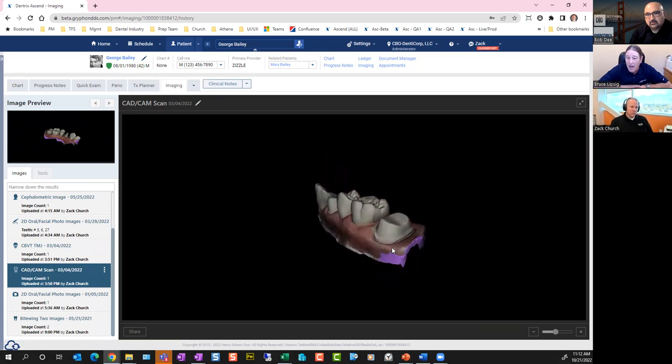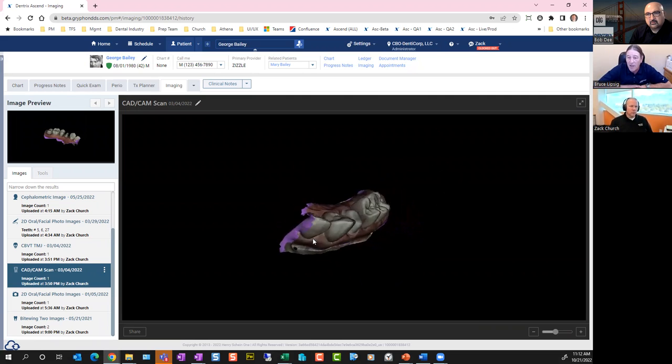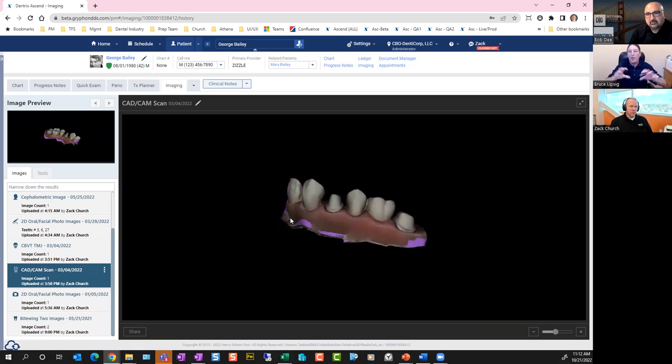Is it in the cloud now? Can I look at it from home when I'm logged into Dentrix Ascend? Can I look at it from another one of my practices when I log into Dentrix Ascend? The answer is yes. All the modalities get brought in and associated with the patient record and shared properly, Bob. That's how we handle CAD CAM today.